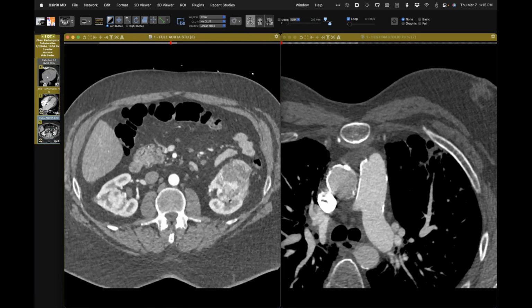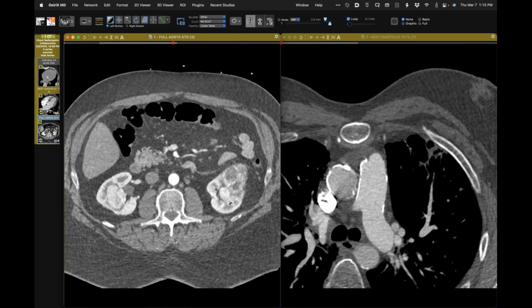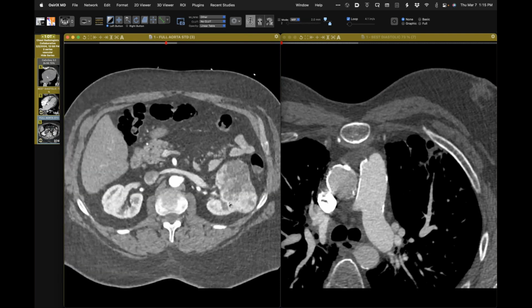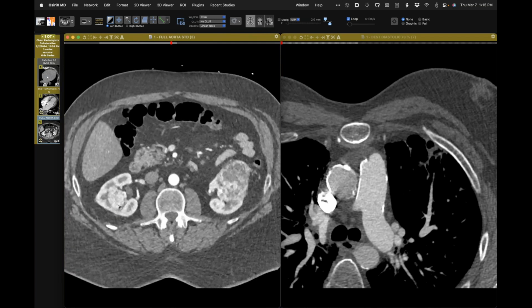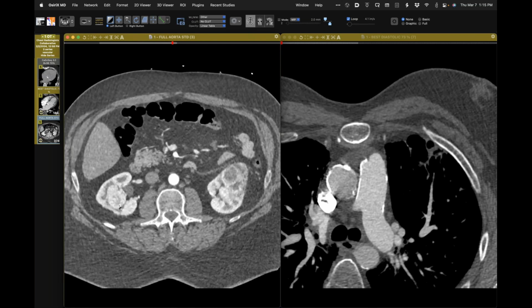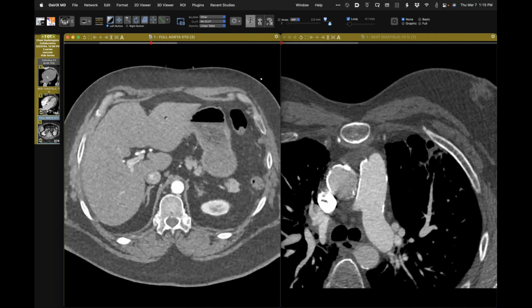I don't associate radiation therapy with bilateral renal cell tumors. That's just bad luck, isn't it? Yeah, maybe. Presumably bilateral renal cell tumors, or some mutation that predisposes them to malignancies. Oh yes, good. Thanks for the comment about the spleen. I didn't look there.